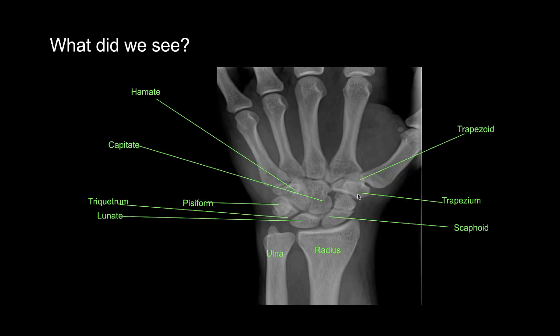And yeah, you're right. So this right here is going to be a little fracture of the scaphoid bone. You see that little line going all the way through. And this is a pretty big thing you don't want to miss. MSK radiologists always look out for this because it can have a lot of consequences and cause a lot of long-term complications for patients. So a scaphoid fracture is a big deal, and it's really big on boards as well, as we'll talk about.